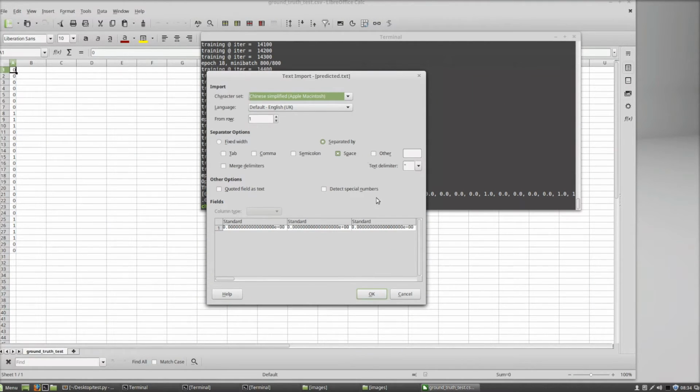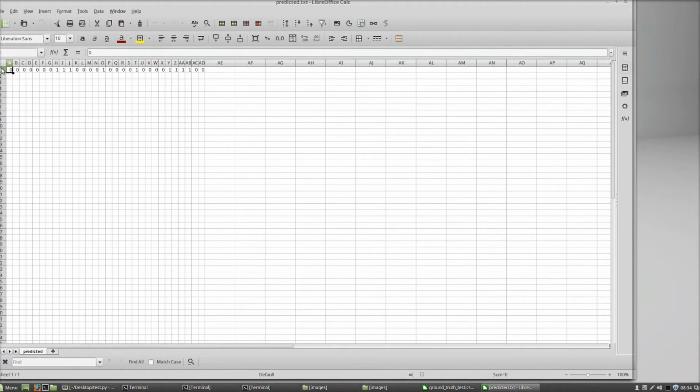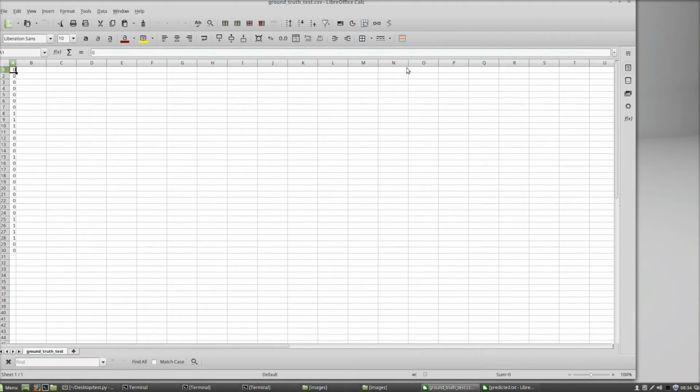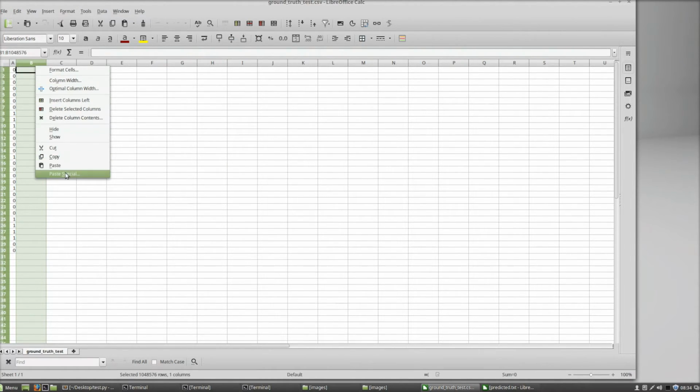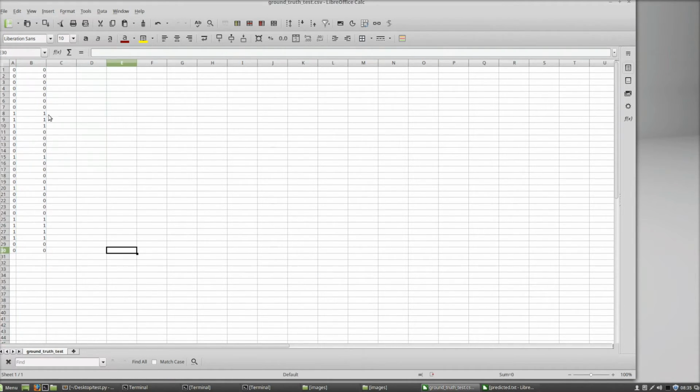We'll just include the spacings. And yeah, I'll just quickly copy this into the pathologist grading to see a comparison. Fantastic. As you can see, it's performed incredibly well. It's predicted with 100% accuracy all of the disease samples. It has predicted with 100% accuracy all of the normal samples, and just from that small amount of training that you saw. So what are the next couple of steps that we plan to take?